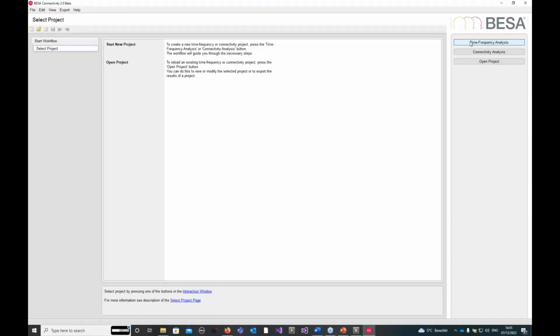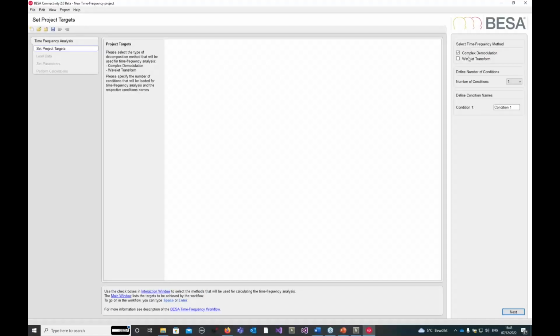And now I'm going to do a time frequency analysis on a number of subjects. So I have two conditions now, and the conditions are, of course, my congruent and my incongruent condition.